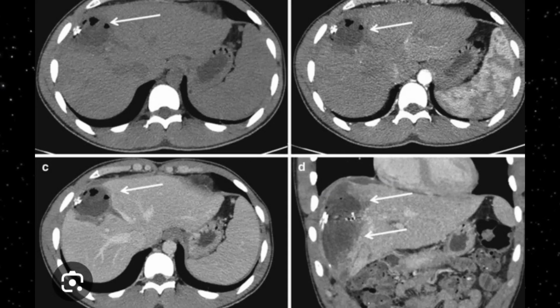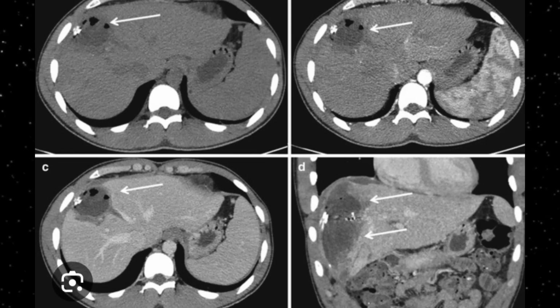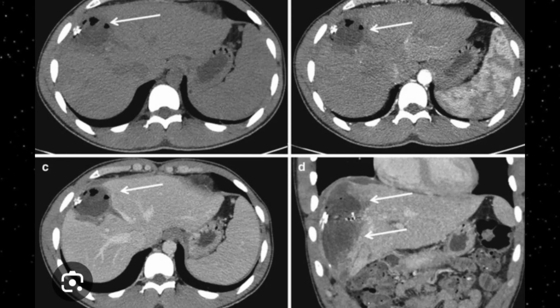Plain CT scan is one of the important tools in the trauma emergency section. When the patient has been through any penetrating trauma, blast or fire injury, or road accident, the CT scan will help you rule out any internal organ damage, internal bleeding, organ laceration or hematoma. Look at these four images.